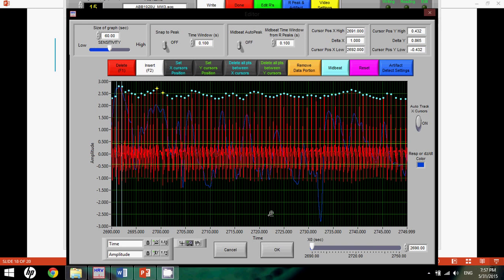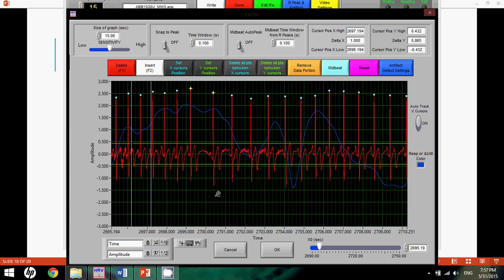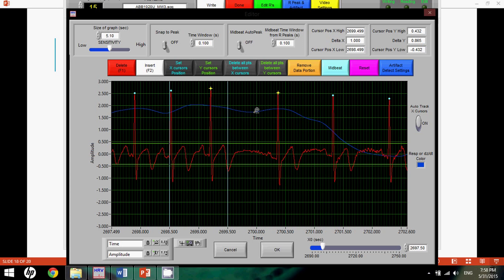Okay, in this case, we see another case of some natural physiological variability, and this is the perfect case of a border situation where it's not clear either way. In this circumstance, again, it'll be best that an expert makes this decision because as you can see, this seems to be rather consistent, where we see just a slight gap, a smaller gap, and then it continues on with a new kind of variation.